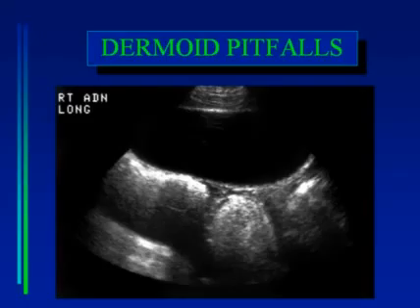On this image, we have both echogenic bowel as well as an echogenic dermoid so that you can see the differences within them. Here is the bowel. The bowel will elongate if one twists and turns on it because, after all, it is a continuous structure. And the bowel will abruptly shadow so that you won't see a lot of the leading edge of the bowel, as we see here. And often the shadowing will have a lot of artifact in it, so-called dirty shadowing, due to the shadowing being from air.